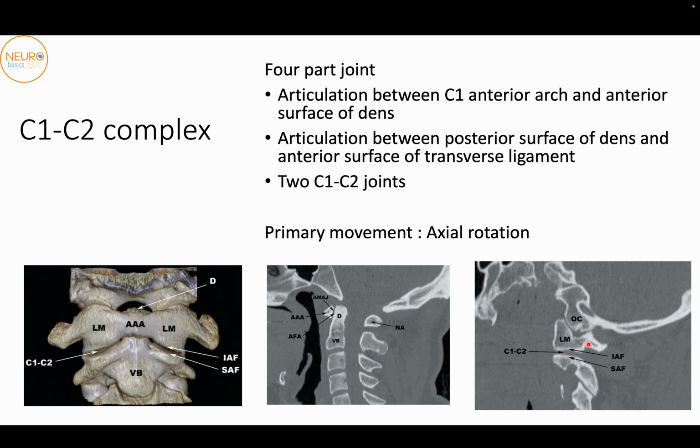Okay, so they are a little bit complicated when it comes to surgical anatomy, but radiologic anatomy it's quite straightforward. Most of them are actually horizontally oriented. Okay, and this is the C1 lateral mass. This is the C2 superior facet. This is the vertebral artery groove over here, and right above the vertebral artery groove, this thin piece of bone that you see, this is the pedicle.